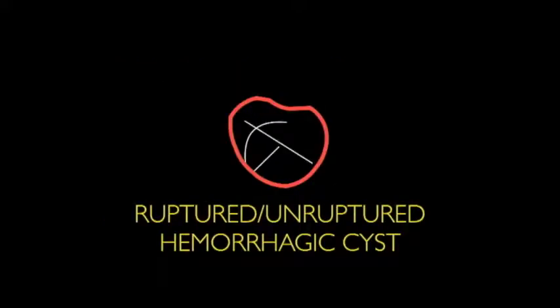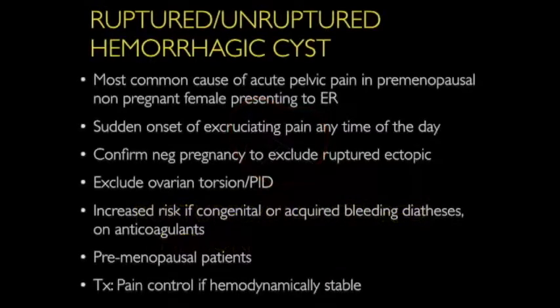We're going to start out with the ruptured or unruptured hemorrhagic cyst. Usually they have a very characteristic appearance and also a very characteristic history. It's the most common cause of acute pelvic pain in a premenopausal, non-pregnant female presenting to the emergency room. That makes sense because women ovulate, and it's common to get ovulatory follicles and corpus luteums that hemorrhage. It's a very physiologic process.